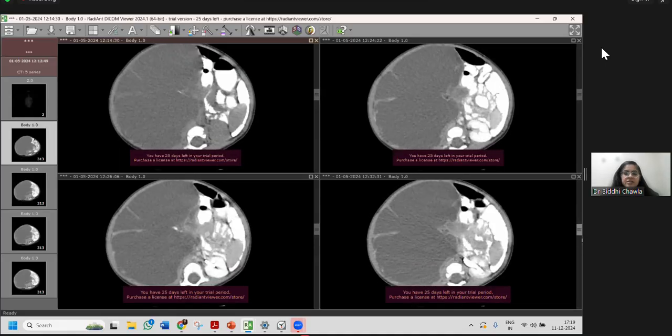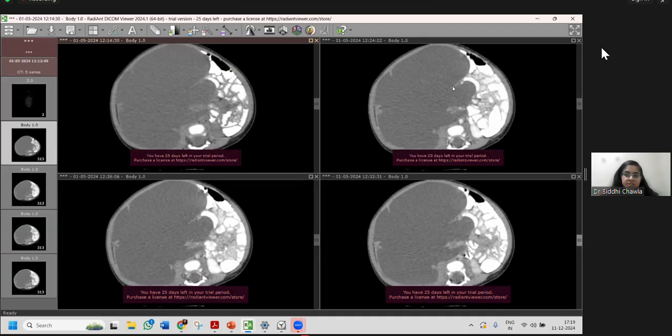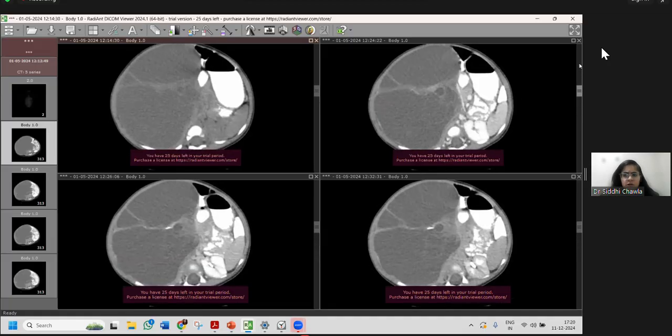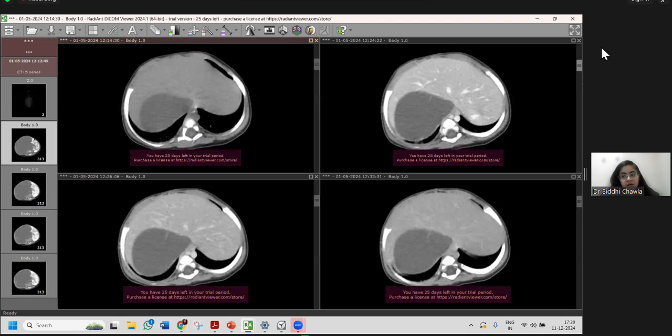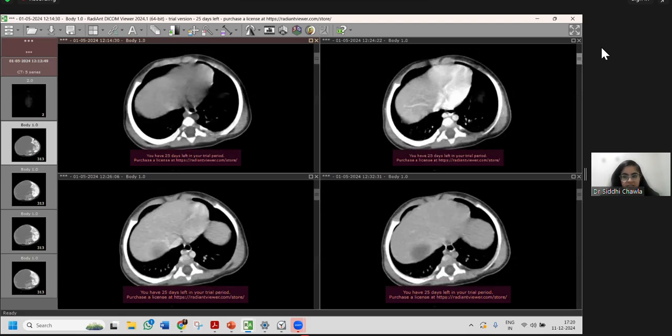One thing which tells us that the lesion is a soft lesion is that you can see how the lesion is extending between the mesenteric vessels. So this extension actually confused me also, whether this was a lymphangioma or some other lesion. So now we go to the pointers that tell us whether the lesion is arising from the liver or arising from outside the liver.